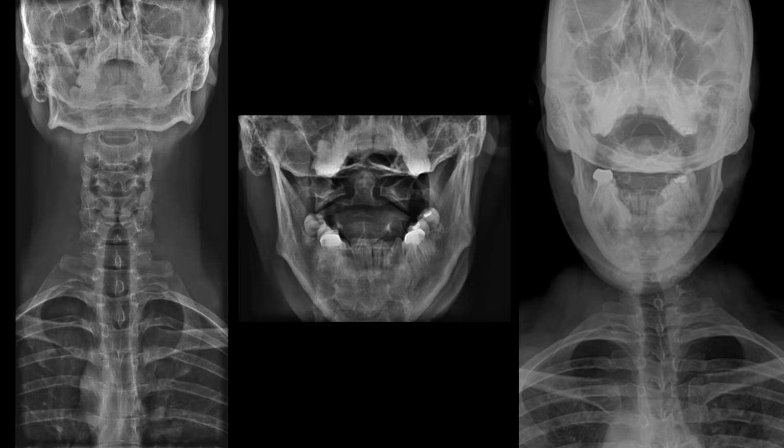So if we look at the cervical spine, there's a number of structures that we're used to seeing that we can't see anymore, such as the occiput overlapping the C2 odontoid process as well as C1, and then the mandible overlapping the mid-cervical spine. Whereas on a normal frontal view of the cervical spine, you can see the uncinate articulations very well, the soft tissues and the lateral aspect of the neck. And then on the APOM view, the dens, periodontoid spaces, and then all the anatomy of C1 and C2. But on this modified view, all these structures are really obscured, and that's a very common thing to see.